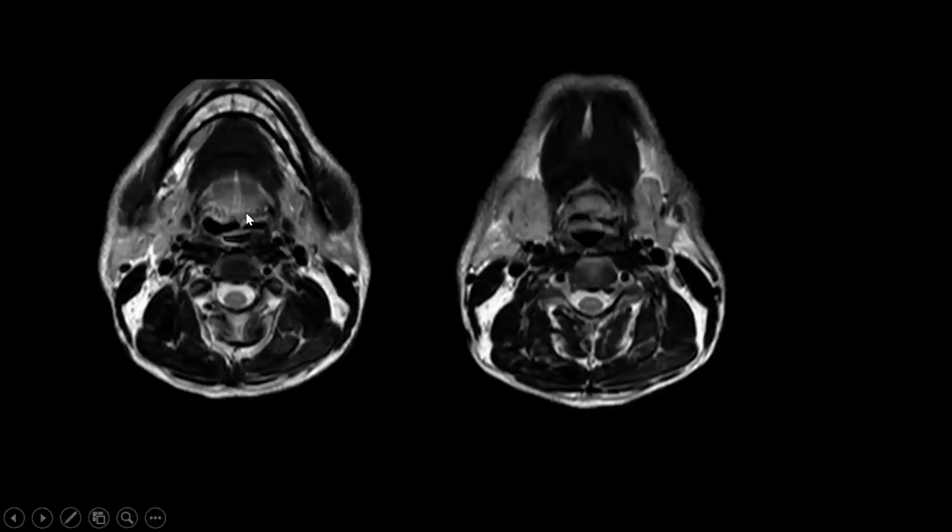This is further down. This I have put to just show the anatomy of the vallecula. I said the vallecula we'll see in axial sections. We can see these paired air-filled structures. This is the epiglottis. This is the glossoepiglottic fold. When these are effaced, we see soft tissue around it, and if one of them is effaced or both are effaced for that matter, that means they are involved.